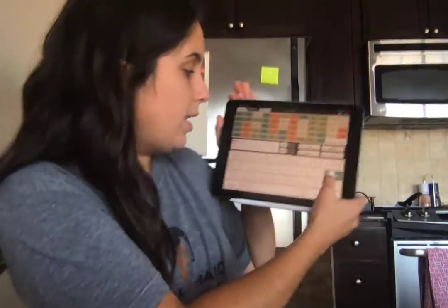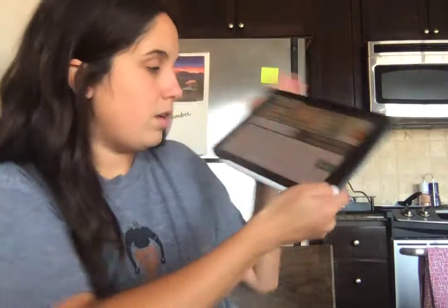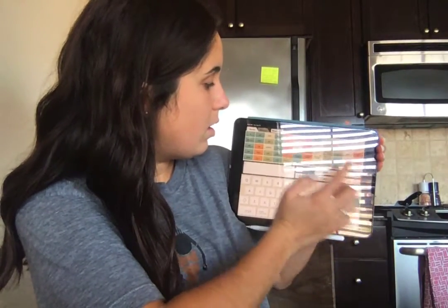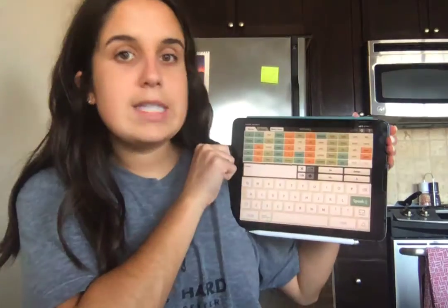So I could type out the sentence. I could say, I could type that out and then hit speak. I have. Or I could hit speak each word on the bottom of that screen. And every time I hit something, I have. It will say it as it goes.